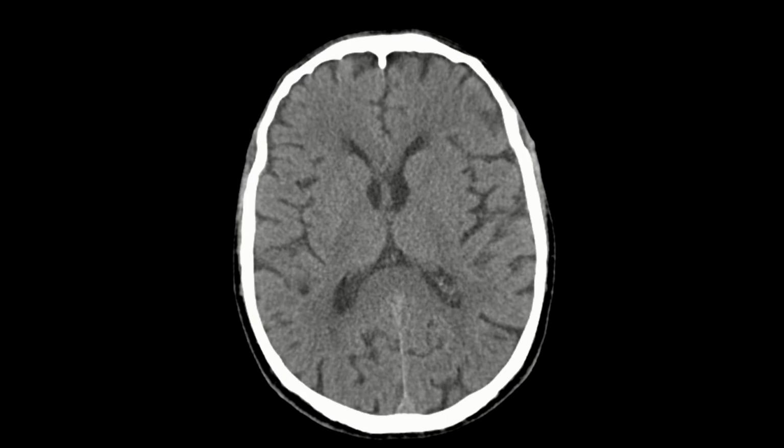So this is the insular cortex, and just like the rest of the cerebral cortex, it consists of gyri and sulci, so it forms this kind of wavy pattern. We call this the insular ribbon. In the setting of an MCA infarct, the MCA also supplies this insular cortex area.